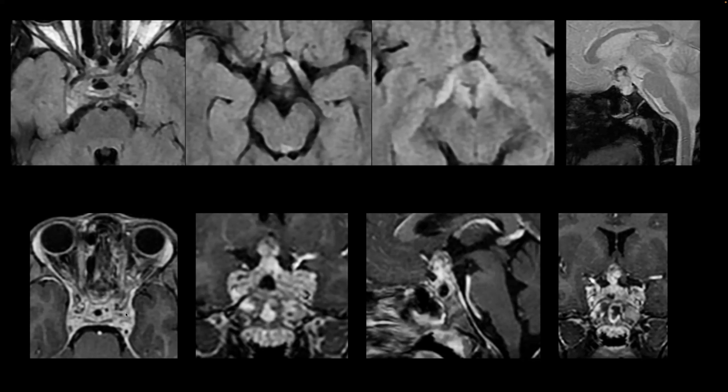scan. The cavernous sinus portion was relatively stable, but there was more extension into the suprasellar and the optic pathway structures. There's also some hemorrhagic component in the suprasellar component, going up to the median eminence and the pituitary stalk.